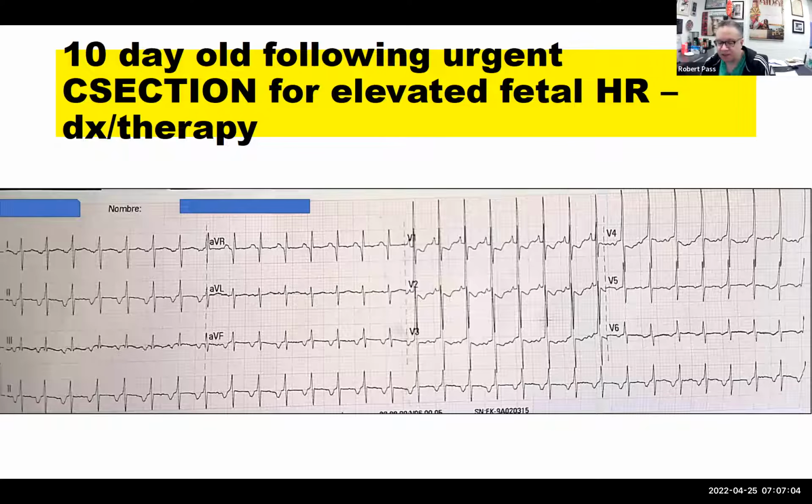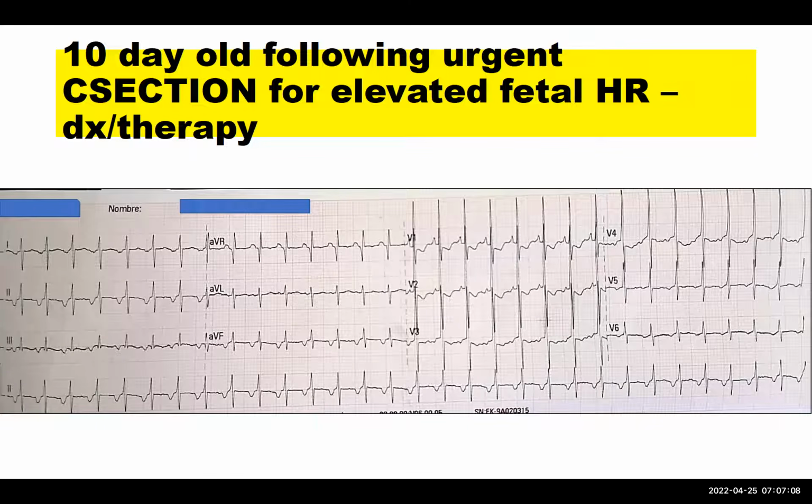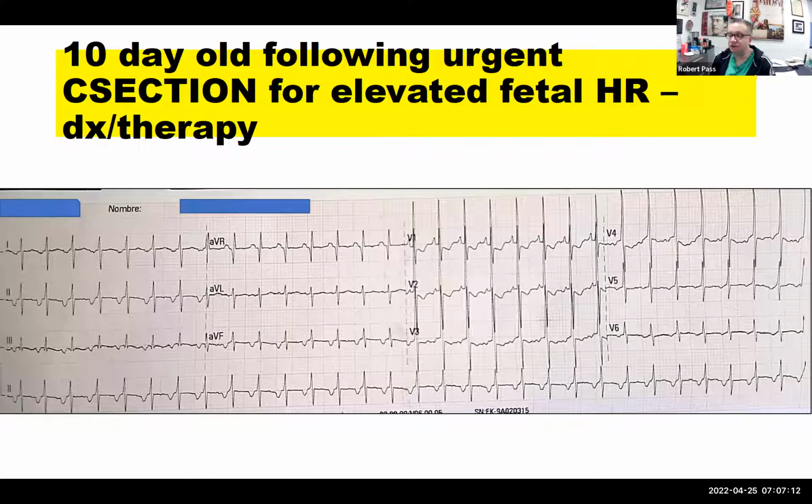And what's special about the accessory pathway in people with PJRT? That it's slow conducting. Right. Very, very slow conducting, which is why the RP interval is so long, right? You said that the RP interval is over 200 milliseconds, which is correct. It's probably more like 270 or 280 milliseconds in this case.